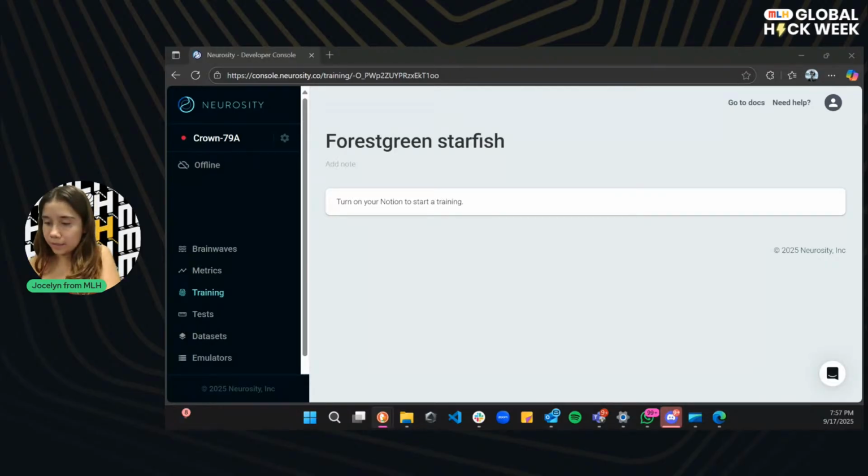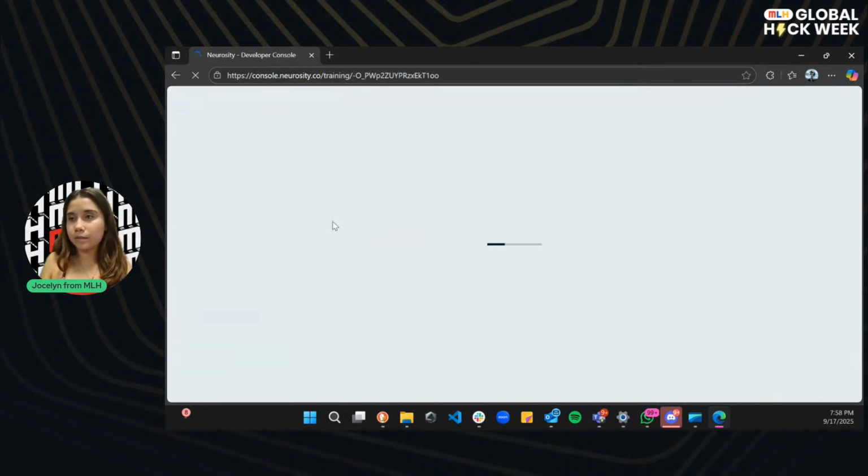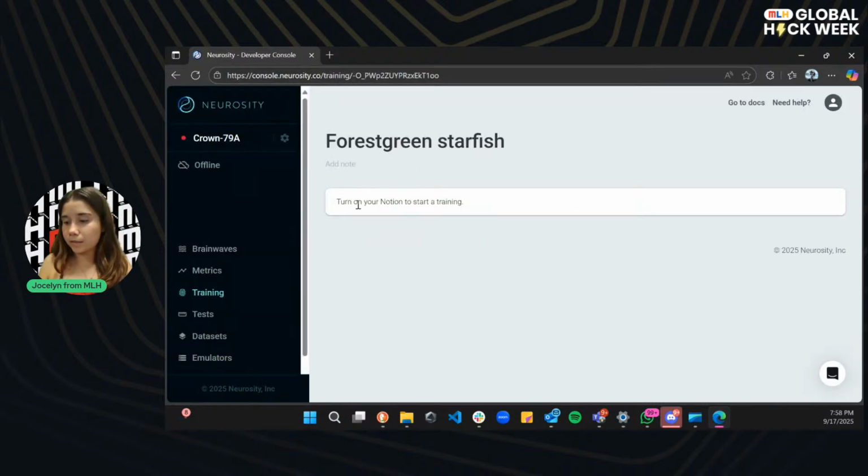Okay, so I think it's up and running. Let me just double check on the dashboard to see that. Let's see. I think we're only missing... Let me try to turn it off and on again. Let me turn it on again.